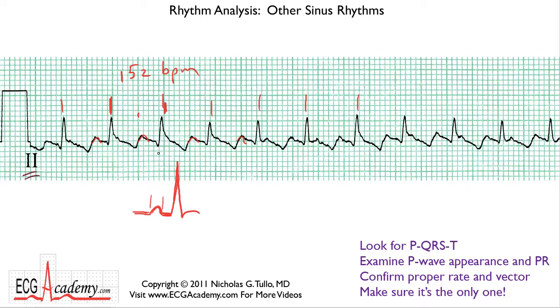the QRS complex. And I would say that the flat part that follows this deflection kind of slopes down a little bit. And that has me bothered. It doesn't look flat to me. And the P wave really doesn't look like a P wave. It's very narrow. It's a very short upward deflection followed by sort of a slopey signal. And don't get fooled into thinking that this is sinus tachycardia, as I'll show you why.